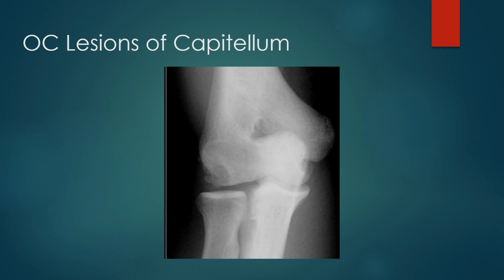Notice how there is focal lucency in the capitellum and some fragmentation. This is pretty typical for an OC lesion of the capitellum, and the locking is probably the result of loose bodies that have started to chip.